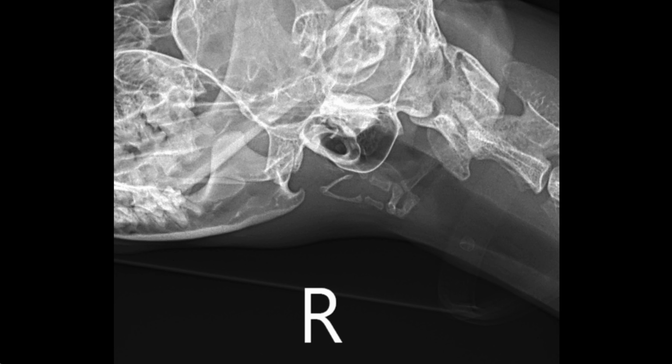Other special views can be used more clearly to define the temporomandibular joints, isolate the nasal cavity, or the mandible. Depending on the goal of the exam, based on your physical exam, a combination of these views may be presented for interpretation. Let's take a journey.